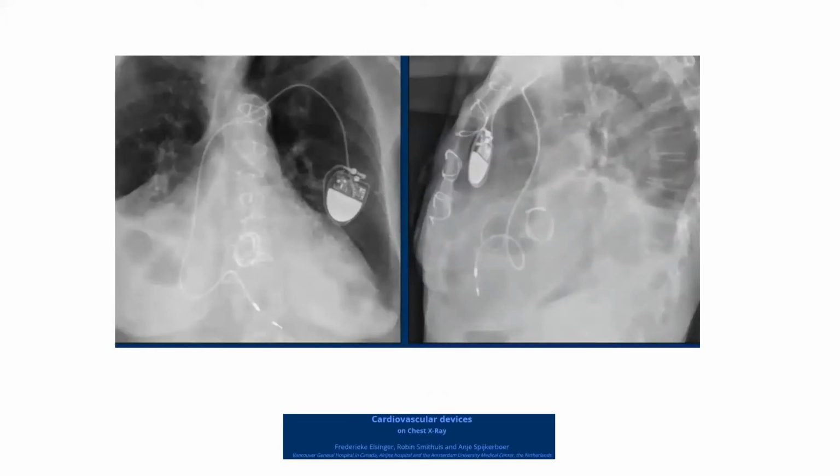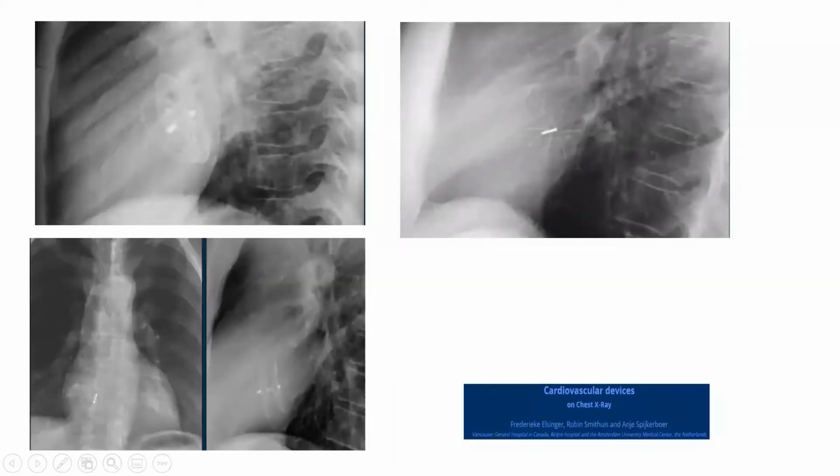Okay, and these are sternal wires. As you see, sternal wires are here. Good, you are doing so fine. Now, anybody can tell me what is he or she seeing? This is an occlusive device for VSD. Very good. Yes, this is occluder device, interatrial occluder device.